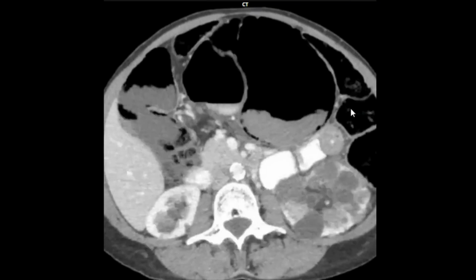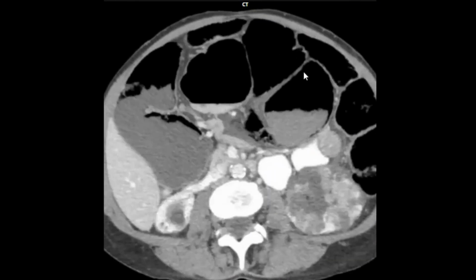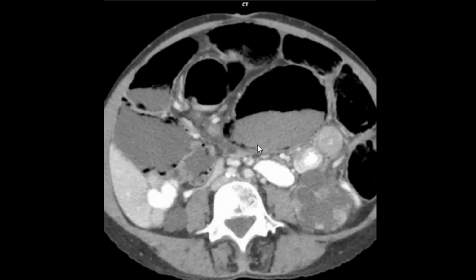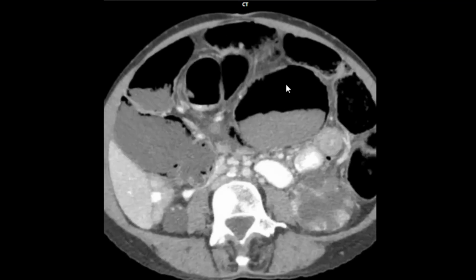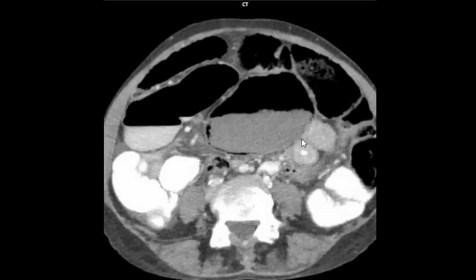One more case. This is another case of cecal volvulus, and what I want to draw your attention to is this abnormal distribution of bowel air, specifically this air over here. This is normal layering of air. The patient is lying down, so the air is going to come upwards. This is abnormal. This is air within the bowel wall, and that's indicative of a vascular compromise, and this patient is likely heading towards a bowel rupture if they don't get immediate surgery.